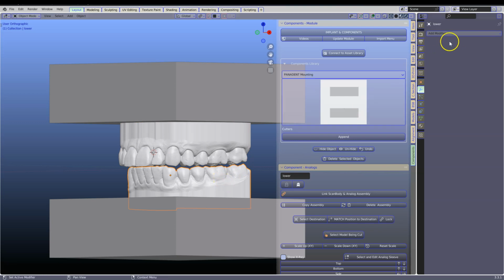Do the same with the other side. Click on Fast, take the dropper, drop it. You can see how it has been cut. Let us then exit, delete these.